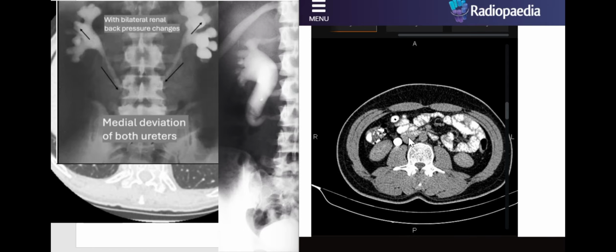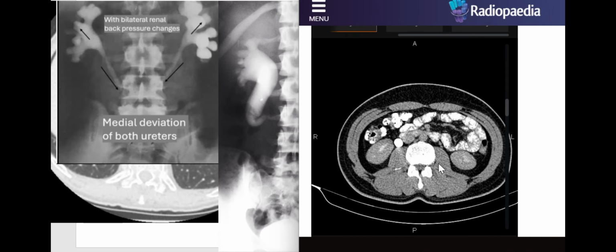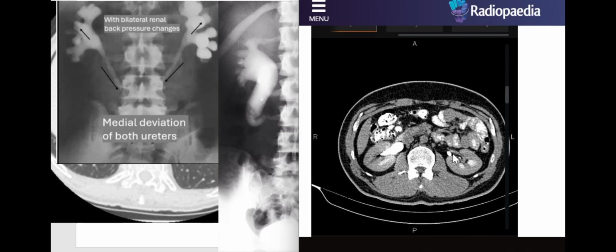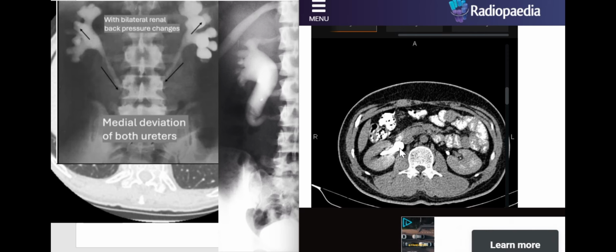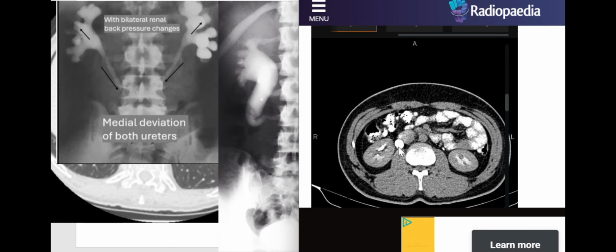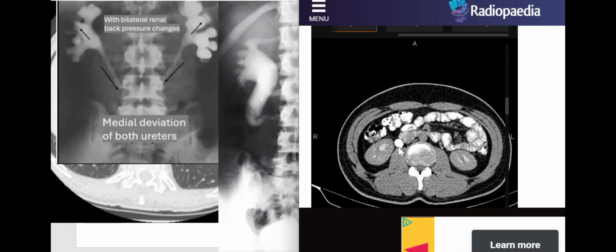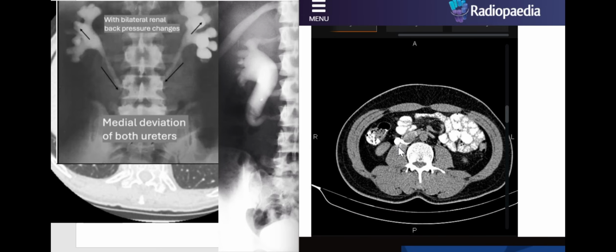This is the CT scan findings of retrocaval ureter. As you can see here, this is the normal left-sided kidney. However, here, this is the right side hydronephrosis and the hydroureter. Okay, so if we go down with this ureter, yeah, this is the hydroureter, dilated proximal ureter and middle third. Okay, if we go down, can you see this?